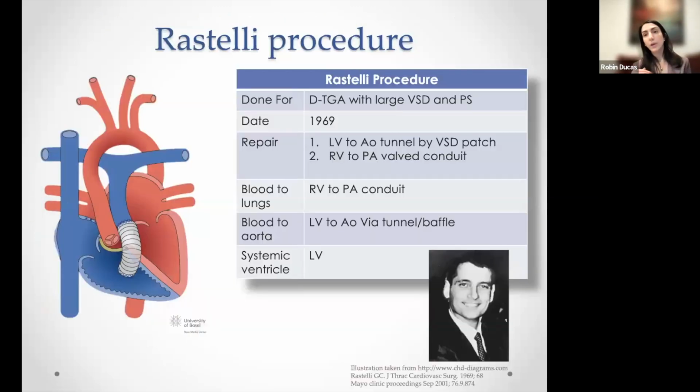So when evaluating those patients, as I mentioned, it's important to look for stenosis, it's important to look for function, it's also important to look for leak if you're concerned.